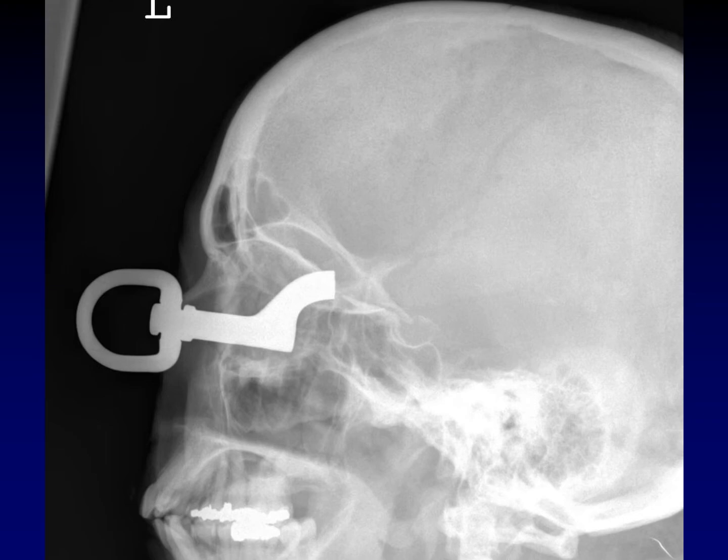This is a larger foreign body within the globe. This happens to be an object called an eye bolt, so there's a particular irony for its location. This was an equestrian who got into an argument with the horse, and the horse won.